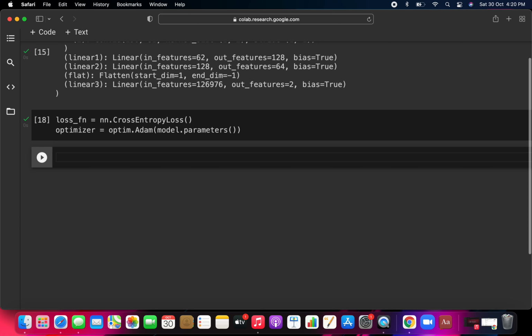Now we start creating the training. Now you have to train the model. For that you have to decide how many epochs you want. Here I am using only 10 for training the model, because it will take so much time. Training will take approximately 5 or 6 minutes. You can write epochs equal to 50 or 60 to try, so that you can see how the loss decreases every time.